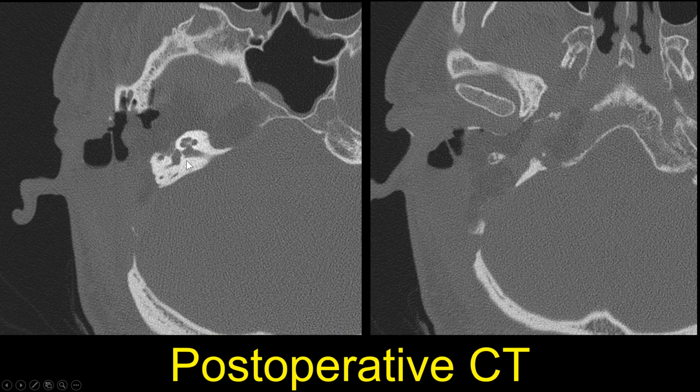So here's that tympanic segment of the facial nerve, and here's the descending mastoid segment. They very nicely did surgery where they resected all the mastoid air cells, but they left the descending mastoid segment of the facial nerve intact, and they did a very nice approach to the petrous apex. With a scope, you can actually cross midline with an endoscope at the skull base itself. These guys were actually way over to the other side through their unilateral approach with the endoscope.